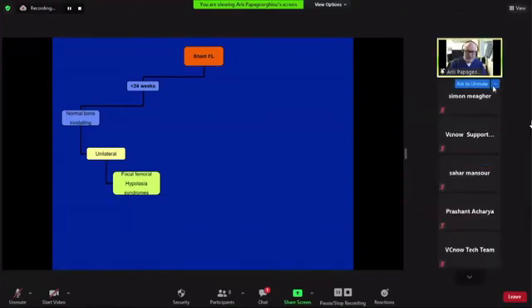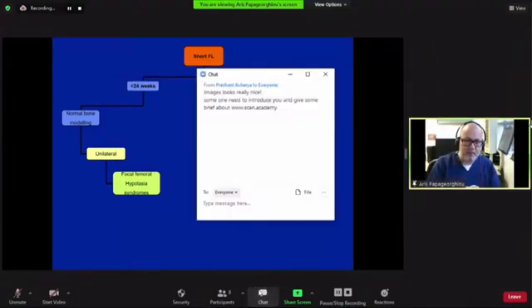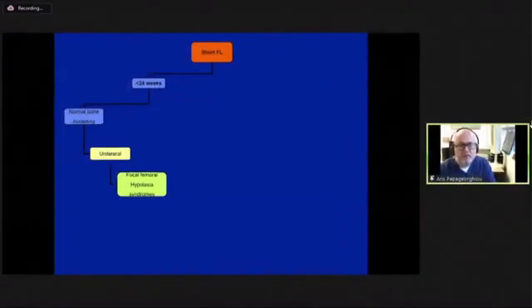So let's start with the earlier ones, and they fall into two categories. One's where the bone modeling is largely normal and where the bone modeling is not. So if you look at earlier onset, say around 20 weeks, and you see that the bones themselves look normal, in other words, they look normally mineralized, they are straight bones, and if the abnormality is unilateral, so just on one side, with a normal contralateral femur, then what you have is a focal hypoplasia syndrome.